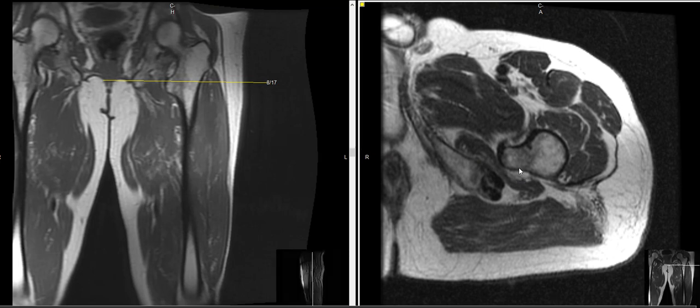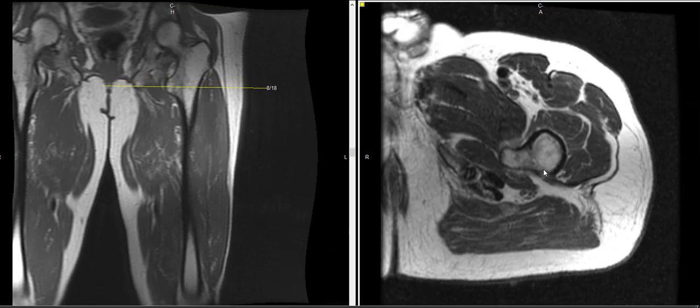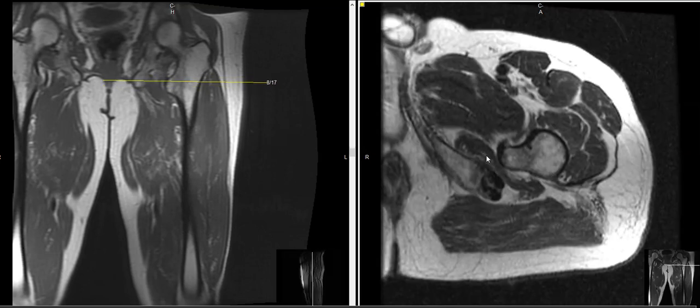And we see this sometimes in patients who are asymptomatic or have other findings, so it may not be clinically relevant. But in this patient, where everything else looks very, very good, and this does correspond to the symptoms, this looks like a case of potential ischiofemoral impingement. Again, there's no edema of the muscle at this time.